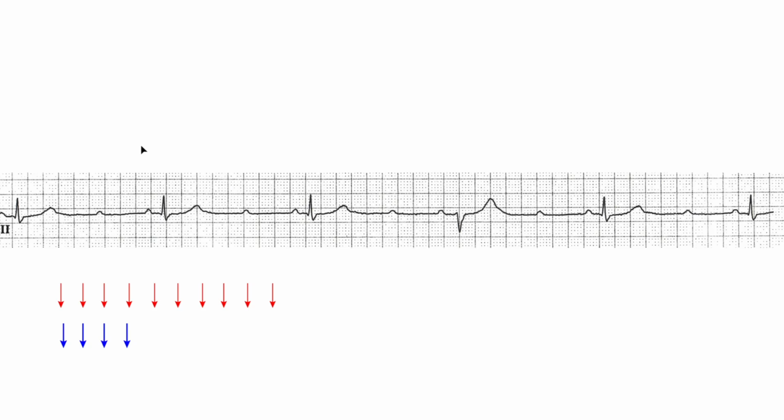But okay, so 10-second strip, channel 2, right? Most commonly used lead. The best you can hope for with a single channel is rate and rhythm, right? Anybody says rate, you immediately say rate of what? And as far as the rhythm goes, maybe you get lucky and figure out what it is on a single channel. Maybe.